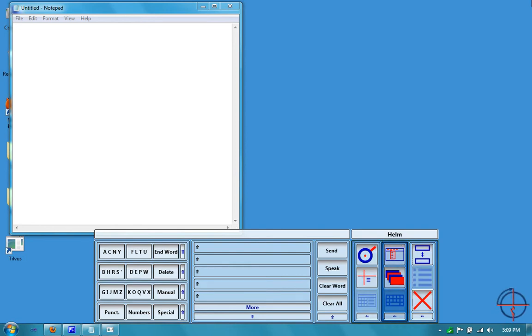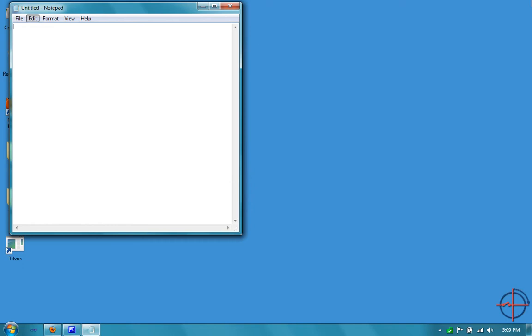At the very top of the middle column is a menu bar scanner, and by selecting this you can highlight different options in the menu bar. You can see here now a Notepad is highlighting the different menu bar options one at a time, and at any point when your option is highlighted you could click and go into that submenu.